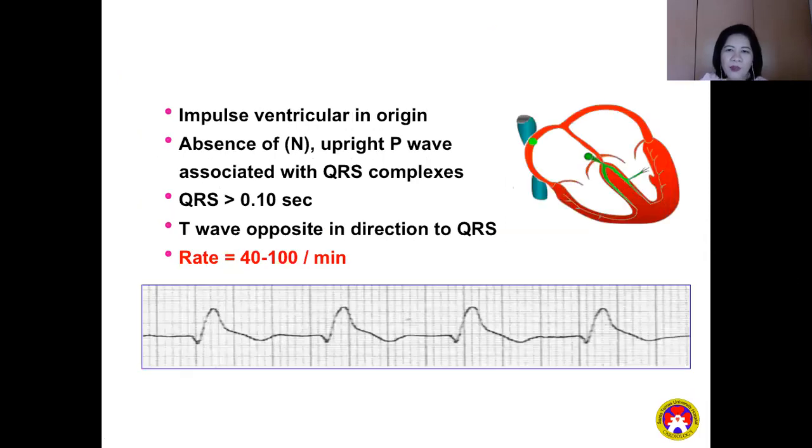Okay, now let's proceed. Here we again see the wide QRS, no? The wide QRS complex regularly occurring with no P before it, okay? But the difference is if we get the rate, 300, 150, 100, so this is around 88, no? But we see the same, like the idioventricular rhythm. It's just that the rate is faster than 40.